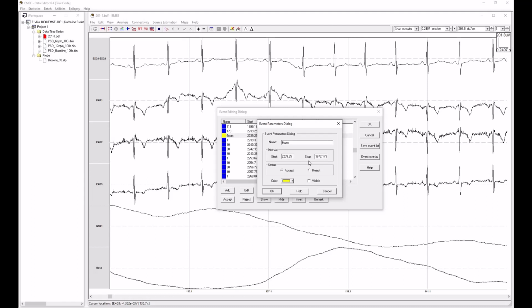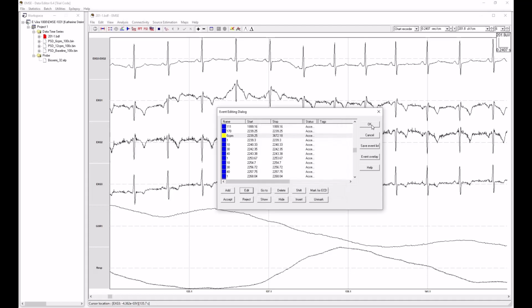Just give them the same name, but with a different start and stop time. So let's say they have paced breathing interleaved with something else, and you want to group it all together. The analysis I'm about to show you can combine all that together as long as you give them the same name. Okay, so that's what I'm going to show you now.